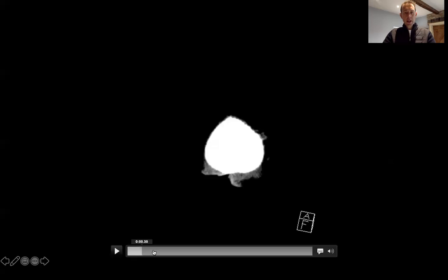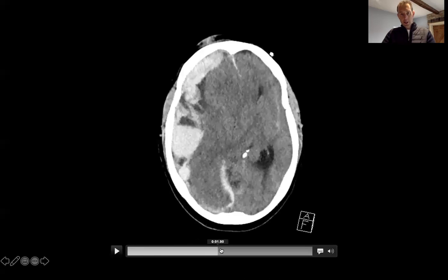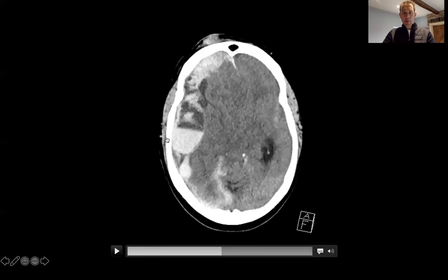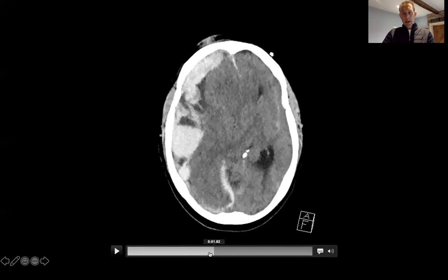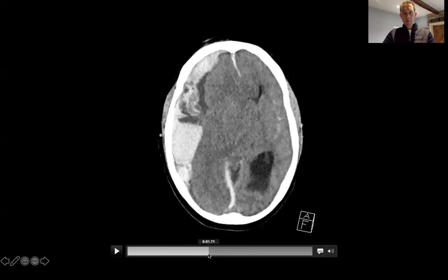Subdural hemorrhages can be very large at presentation. This patient's got ongoing hemorrhage within it. You can see fluid levels and low attenuation. And you can see that marked right to left midline shift this time. This is the temporal horn of the right cerebral hemisphere pushed right away across the midline. So the midline shift is really quite marked in this case.